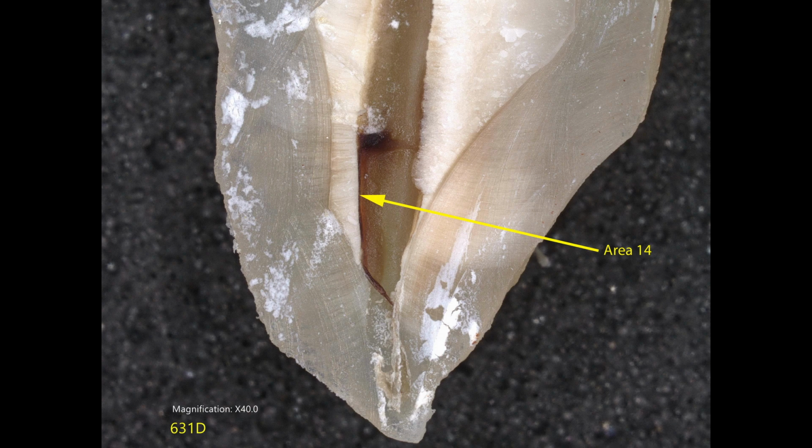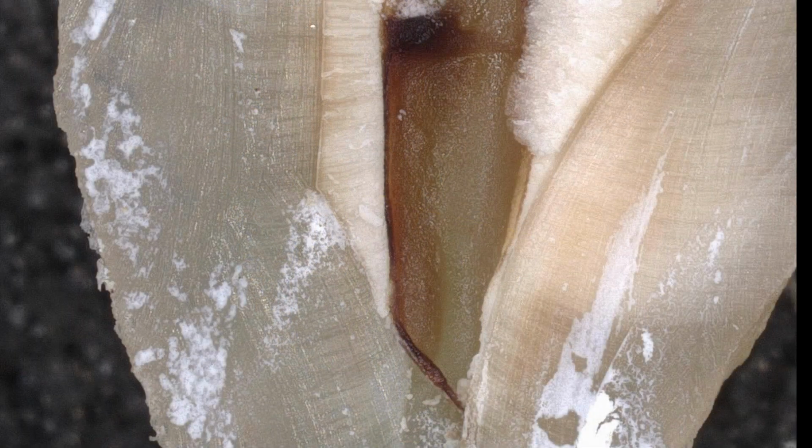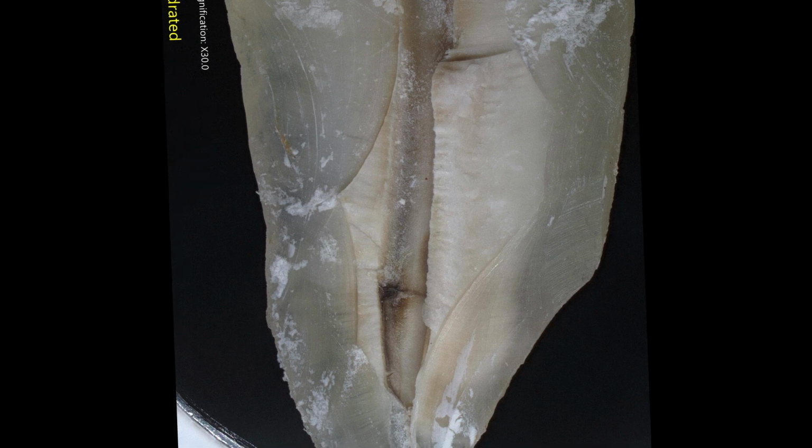I'm going to spend some time helping you with your pattern recognition in correlating the wet specimen with the dried specimen and the sputter-coated specimen, because it is important to be able to identify exactly where you are observing. Such correlation is a learned skill. We are going to look right where the arrow is pointing. The same view as a semi-dried specimen makes the pulpal stump harder to identify, and the closer view should help you with your pattern recognition.